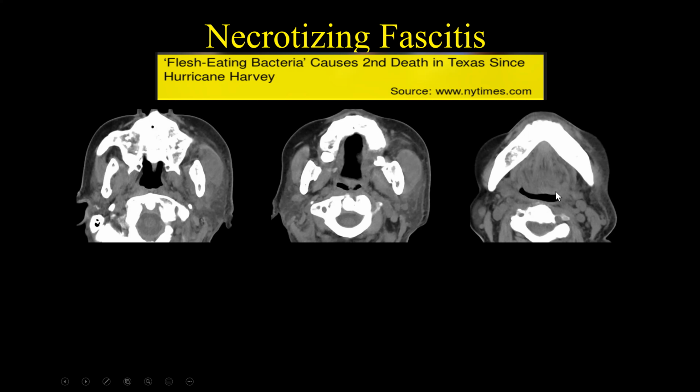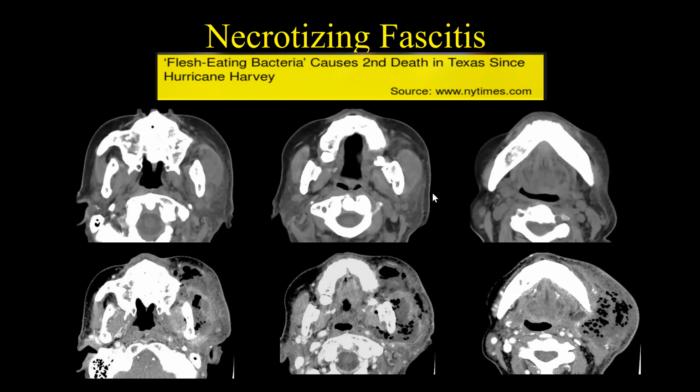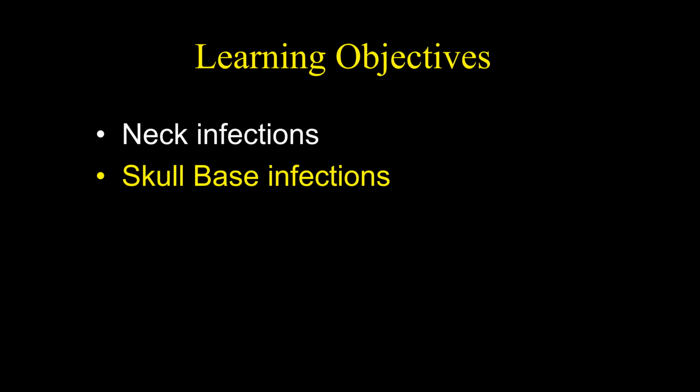Now, clinically, this patient had necrotizing fasciitis, but quite frankly, we can't call it. But unfortunately, this patient went on to develop progression of this disease, and this was obviously severe myositis and abscesses, and all of this air allows us to make this diagnosis of necrotizing fasciitis.